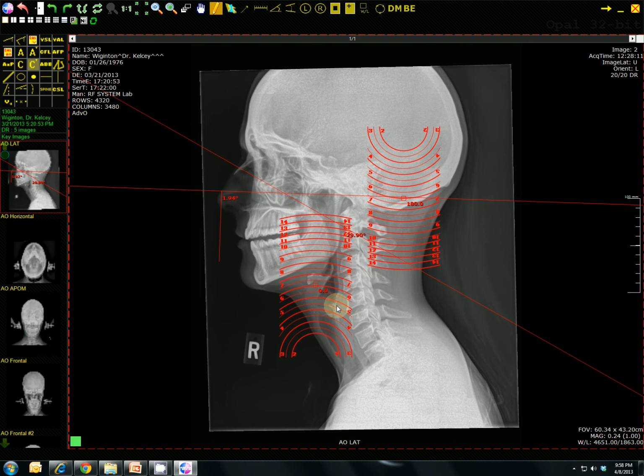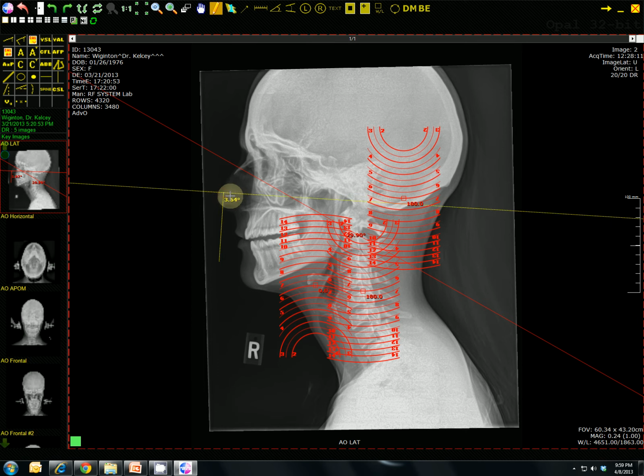all the annotations. Alright, to select an annotation, I want to first make sure that nothing is selected. Okay. Now when I hover over any of these boxes or any of the points, you'll notice that the color will change for that template or line. Now if I left click that point, it changes color again, letting me know that I have now selected that template or line. Now I can manipulate it however I want to, and if I want to, I can also press delete and delete that annotation.